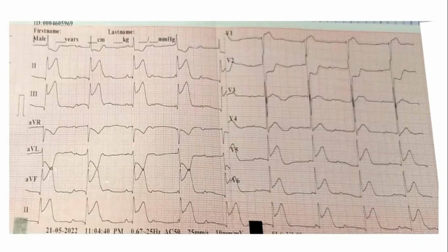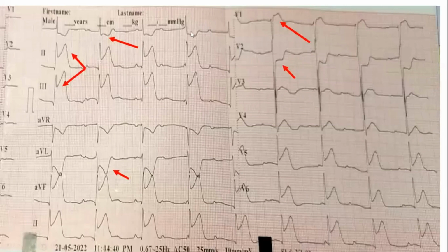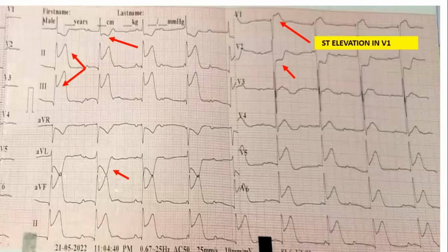But what about the anterior chest leads? So what do you think? This is an RV. I have given you. So let's move forward. I think nobody would like to comment further. Yes, sir. To diagnose RV infarction, as we can see, in V1 there is ST elevation and in V2 ST depression. When we have V1 ST elevation and ST elevation more in lead 3, it directs towards the RV.